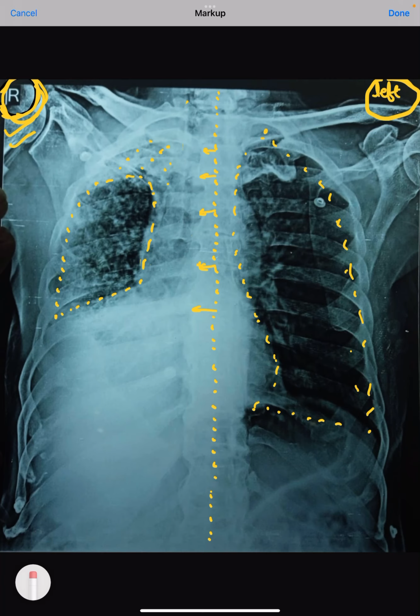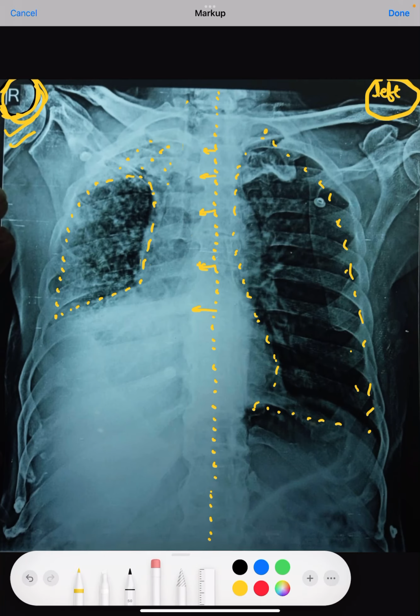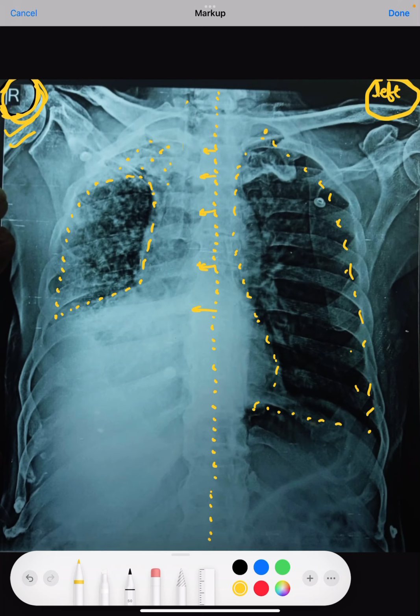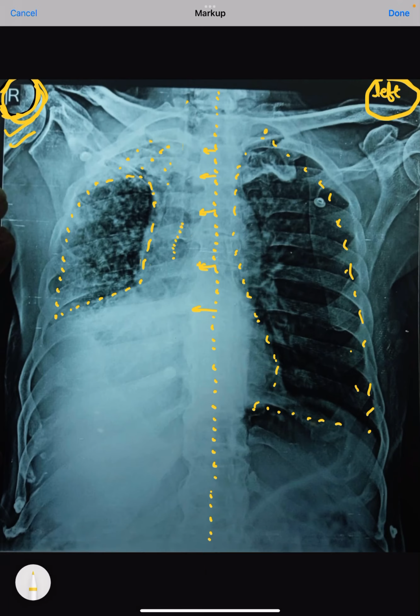I'll simply clear the structure so that you can very nicely make out. See, this area has to be the trachea. We can very nicely make out. I'll simply highlight this. So if you can trace this, this is all airway. So this is the trachea basically, and that is all shifted toward the right side because of this fibrous lung tissue, which is simply pulling the mediastinum, trachea, and the mediastinal structures toward the right side.